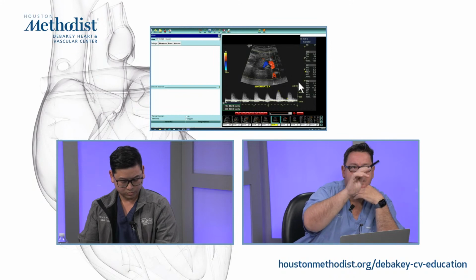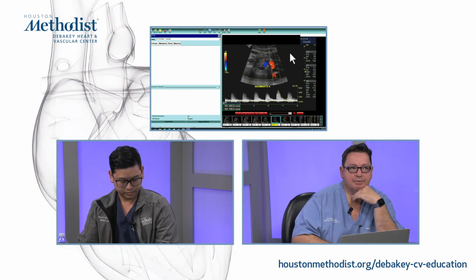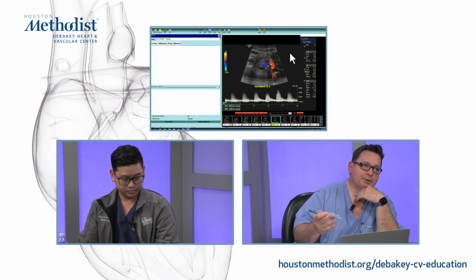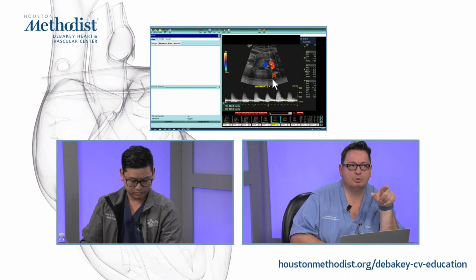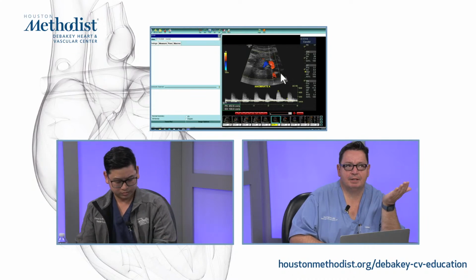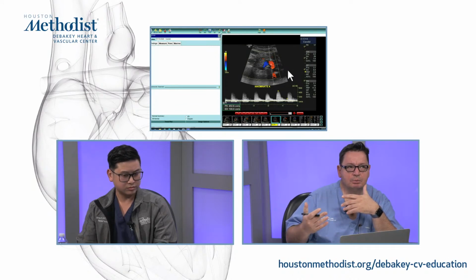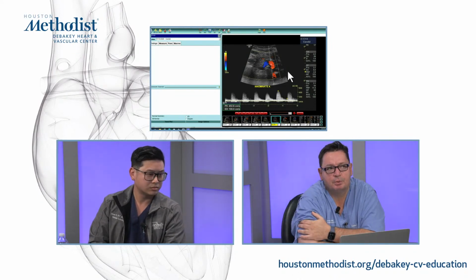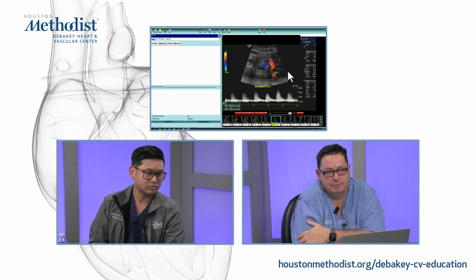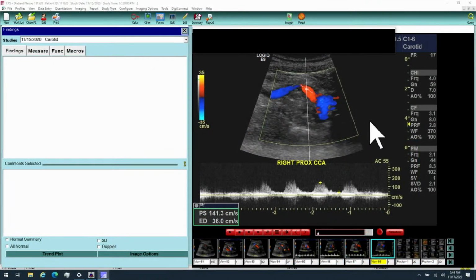You can see the blue signal, that would be your subclavian going down. And that tortuosity is going to give us a challenge if you want to treat this disease, coming up from the arm or coming up from the aorta. Those are the options. But the bottom of the color box gives you a little clue too that you do have an open vessel, getting antegrade flow into the innominate vessel, because a questionable innominate occlusion would change the surgical and treatment options. But definitely imaging correlation is recommended here too. And the last one is just one more measurement. Very good. Thank you, sir.